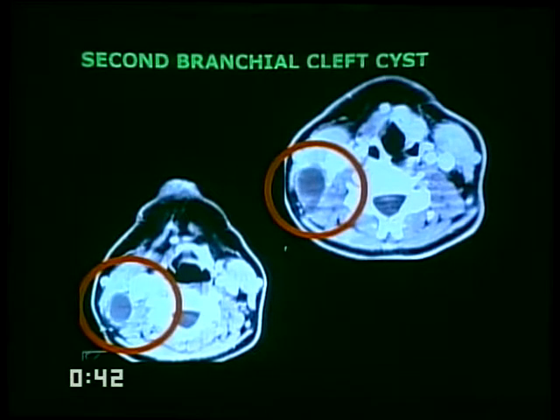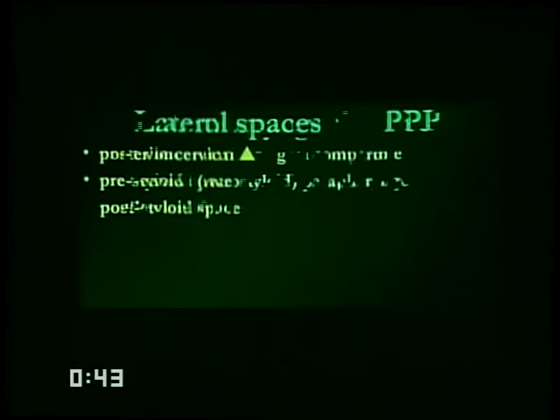However, if people have tried to biopsy this or somehow intervene, this could be secondarily infected. Most of these are just removed. It is quite impossible to determine before biopsy whether or not these are secondarily infected. Most of them are not, but they are not simply cystic foci. They have complex cystic characteristics when you analyze them using MRI or sonography in the local region.